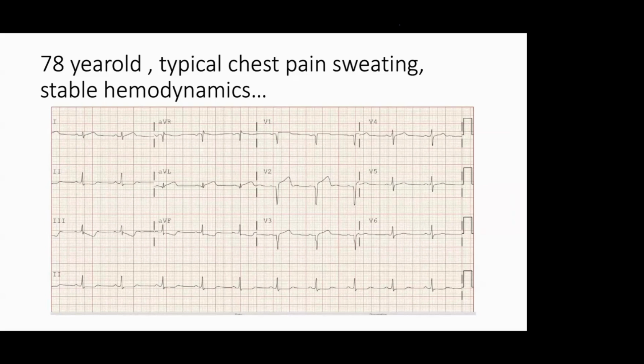Can anyone tell about this ECG findings? I can tell, then you can tell the management also. Inferior wall MI. Yeah, not inferior wall. ST elevation in V2, V3. V1, V2 also have ST elevation. V2, V3 septal infarction pattern. Then you are seeing reciprocal ST depression.